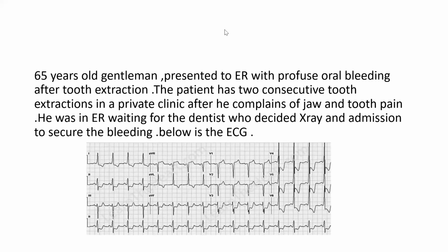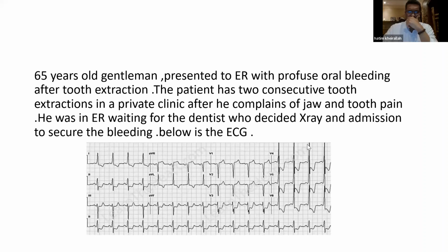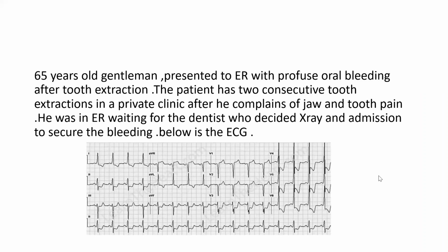Zainab, if you want. You want our comment, boss? Yeah. This widespread ST depression, more than ST depression in more than 6 leads. Exactly. And ST elevation in the aVR, and in aVR more than V1. So what does that mean? That indicates left main. Yes.